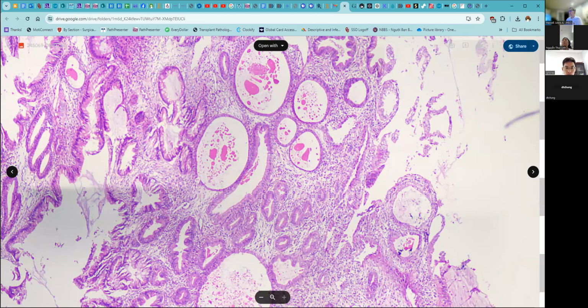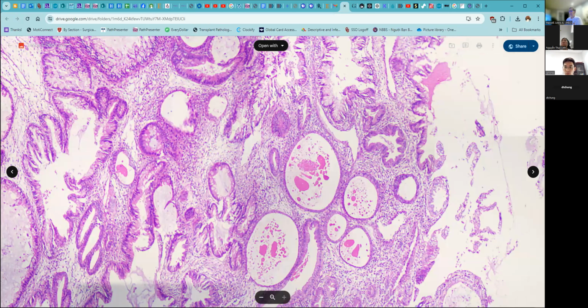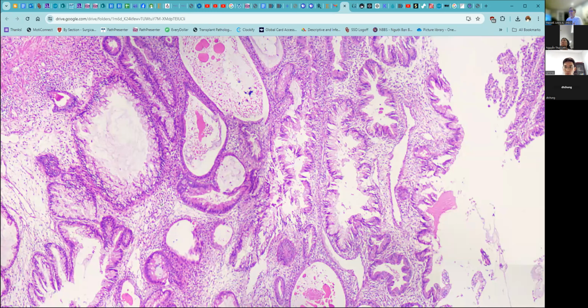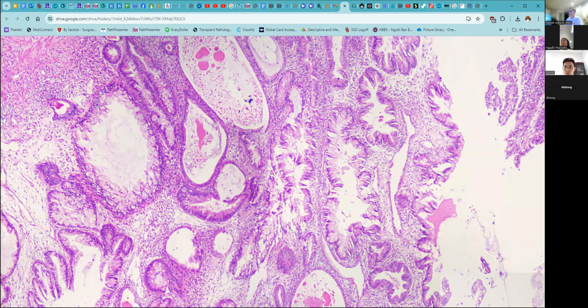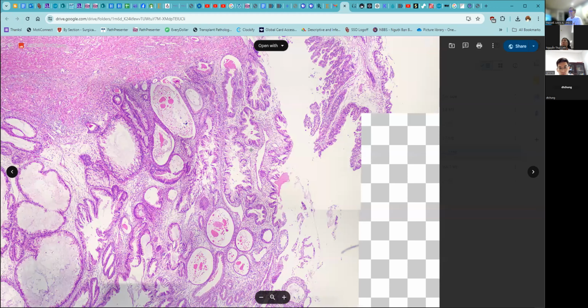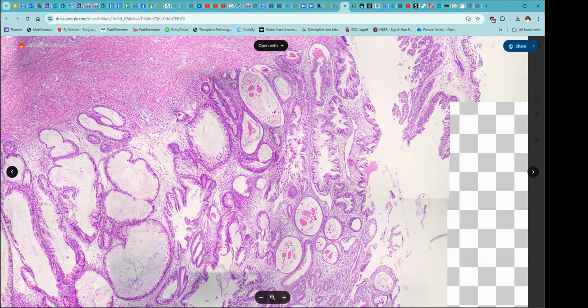So to me, this looked very much like the possibility that this was a very low-grade neoplasm. There's not much nuclear atypia. There's not disorganized single-cell infiltration. It's generally large glands and large cystic spaces with relatively low grade. Now, that doesn't mean it's totally benign.